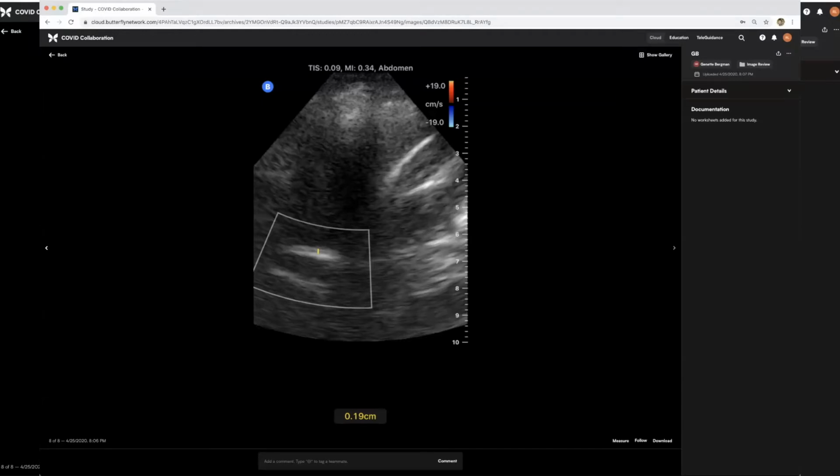Fantastic. Yeah, so I think they did a really good attempt here on their contracted gallbladder and finding the portal triad. Awesome study. I'm going to ask you to stop screen sharing for a second, Rachel. I want to show you just a contrasting image, which is complementary to what we were just talking about.